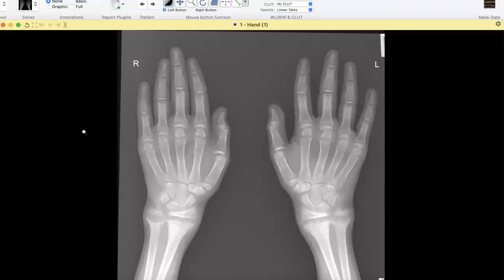Well, in a patient with an immature skeleton, rickets is the first differential that comes to mind. As far as the fraying of the metaphysis is concerned, I think some anemias or hemolytic anemias and such hematological disorders can also cause this appearance.